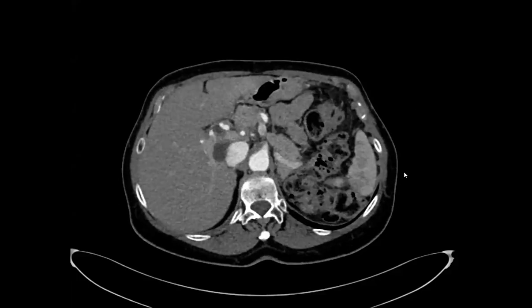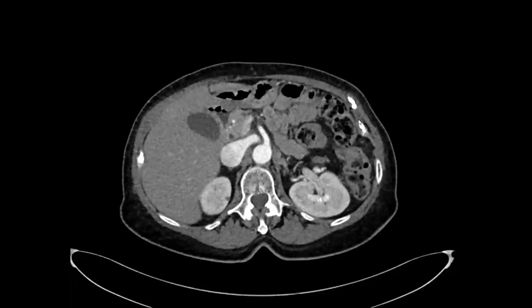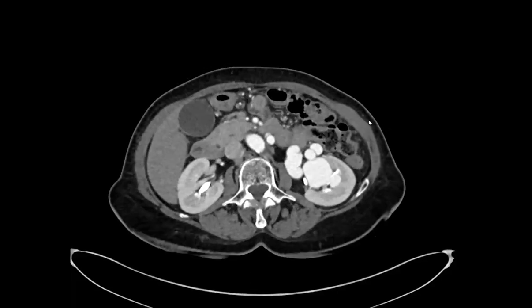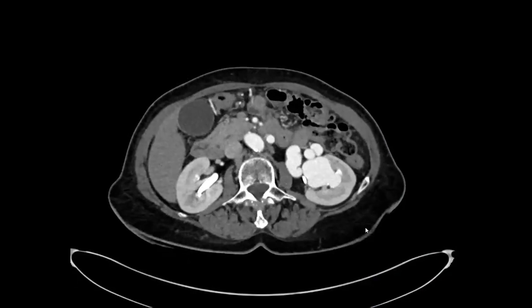Okay, this is just a cute one. The patient has gross hematuria. So with microscopic hematuria, a lot of the CT urograms are negative because there's lots of benign causes of microscopic hematuria, but gross hematuria is more common to actually find something.